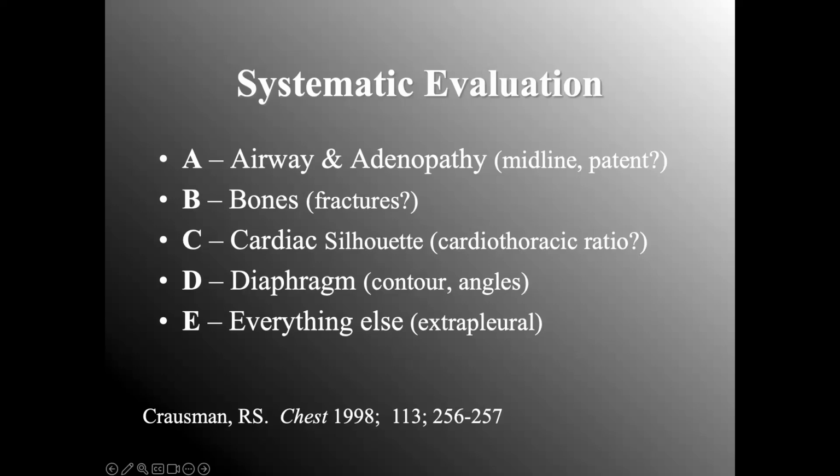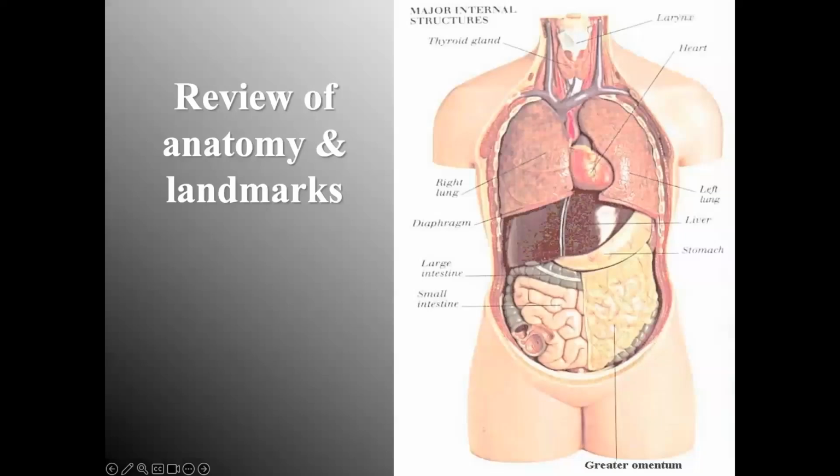All right, a good systematic approach to any diagnostic test, but you have to know the anatomy in particular to evaluate a chest X-ray. When evaluating for diagnostic purposes a picture of the human body, would it not stand to reason that a chest X-ray would encompass just about everything you see here, less the pelvic region? Particularly with a chest X-ray, where the image is simple, black and white with a little gray, and is only two-dimensional, it is necessary that you are able to reference normal anatomy in order to identify any abnormality. You have to know the anatomy.